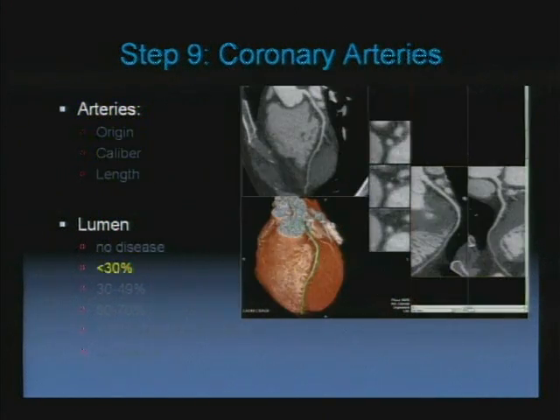So no disease. If you see a little bit of something that shouldn't be there, so there's the lumen, and you have this little trace of soft tissue, then we describe that as less than 30% luminal stenosis, and we compare it with normal segments either above and below whatever we have. Okay. Some say it's less than 10%, some will say it's less than 50%. It really depends on how you do this, but we use it as less than 30%.